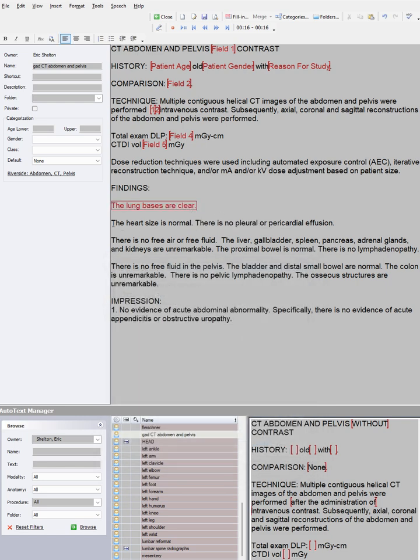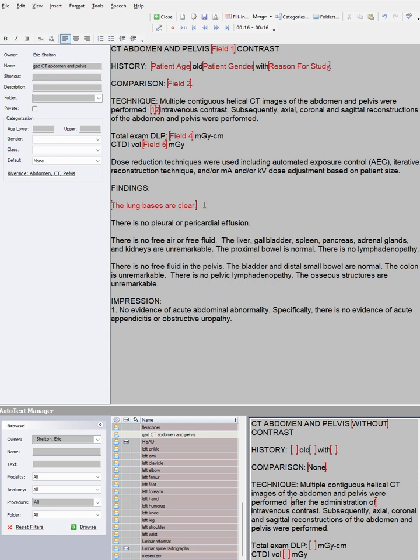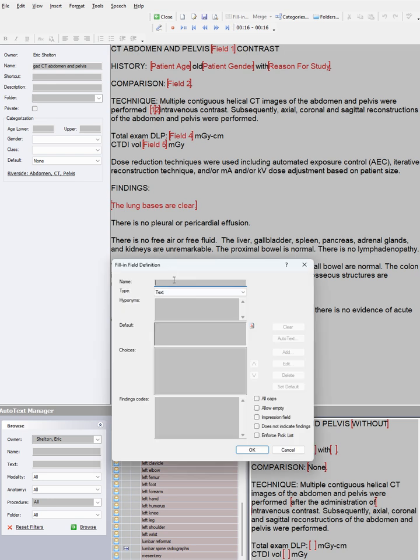We're going to generate this next one here. So I'm going to highlight, I'm going to cut, I'm going to put my cursor where I want to put it. Then I'm going to click fill-in mode. Just paste here for the title, paste for the default. Then once again, I'm going to ask myself, what are abnormal trigger words that I use to describe the heart that I wouldn't use in other places?